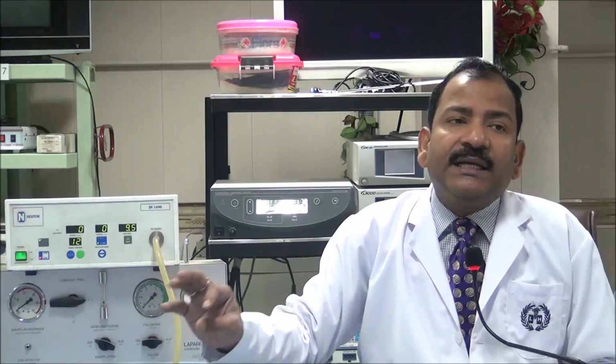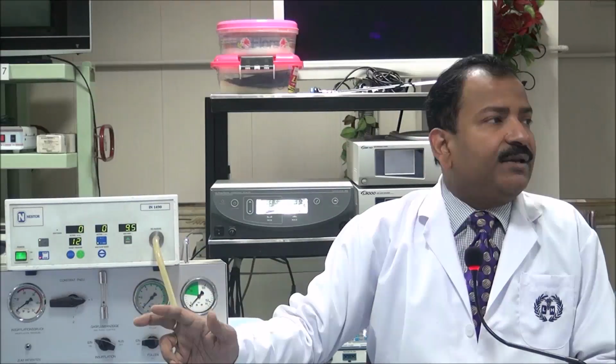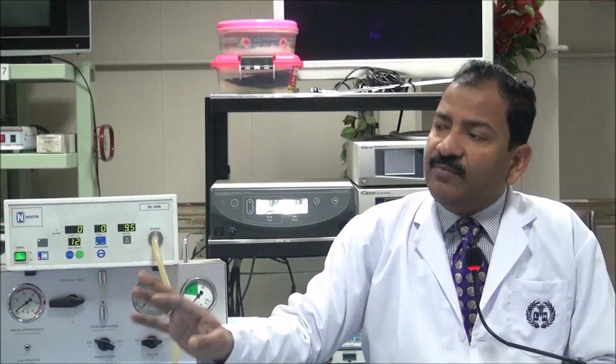Next variable is the anesthetic agent which you are using. If you are using nitrous oxide as anesthesia, then there will be some problem, that nitrous oxide always distends some gas, and that gas escapes into the free cavity. So nitrous will distend the bowel, and then your working space will be reduced. But if you are using isoflurane or sevoflurane, then they don't distend the bowel, and if the bowel is not distended, you can put more gas.